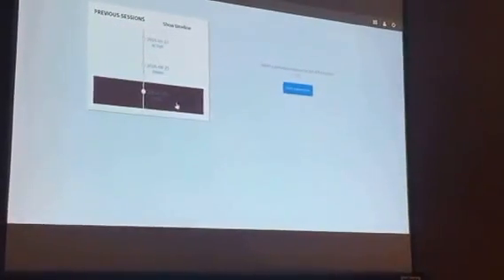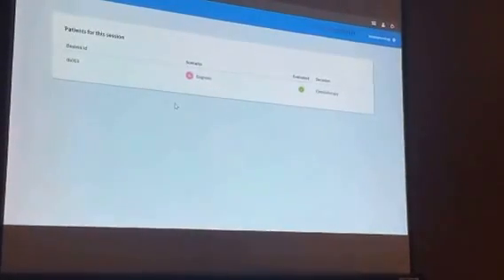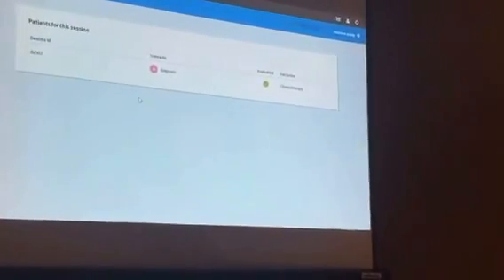There are different scenarios for each breast cancer patient. There is the diagnosis phase. There is a treatment between the diagnosis and the surgery. There is a surgery, and after the surgery, the follow-up of that patient. Not necessarily all the patients will go through all the scenarios. It might go from diagnosis directly to surgery and so on.